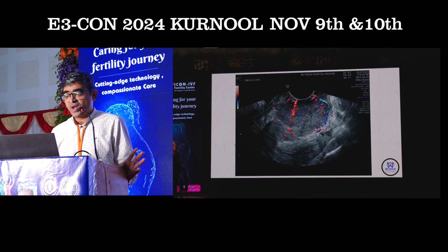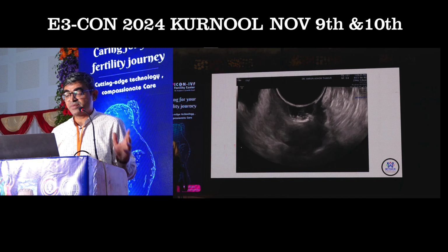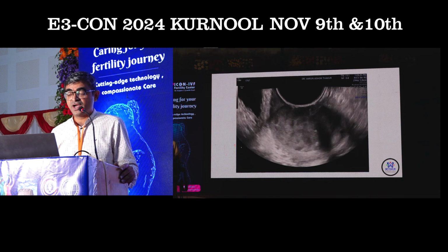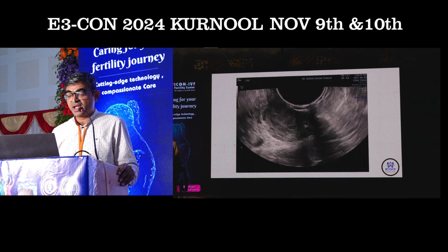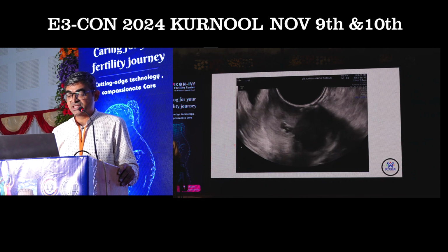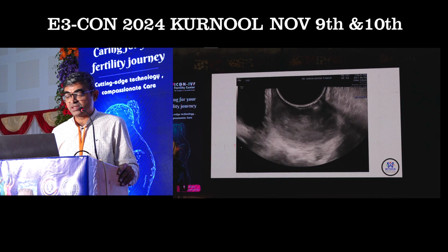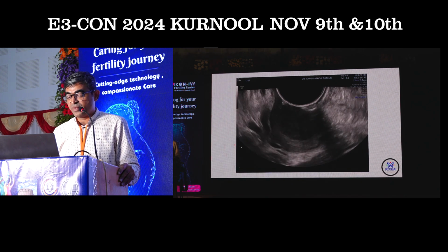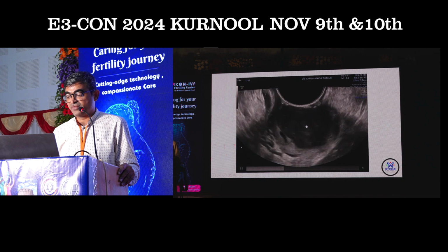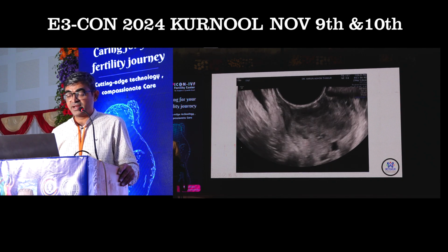Sometimes you have a bossellated lesion in the cervical canal, and when you have not done a clinical examination or a per speculum examination, these might be incidental findings for a radiologist. So when you put color, you will be able to appreciate that this lesion is likely to be a cervical growth, that is CA cervix. So again, play with the colors. Colors will help define the vascularity, which is irregular uptake and highly vascular.